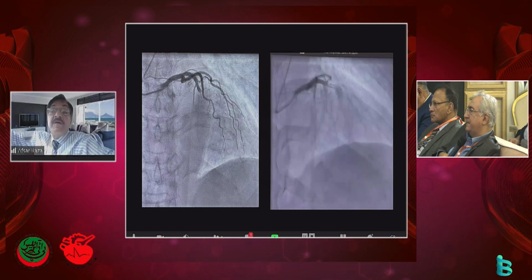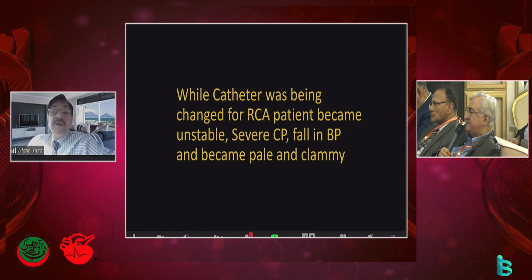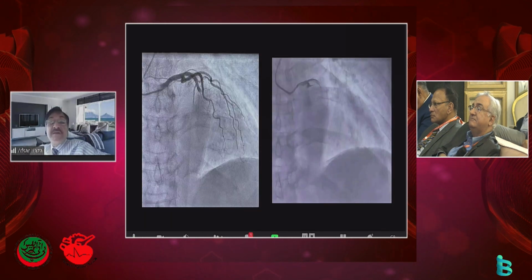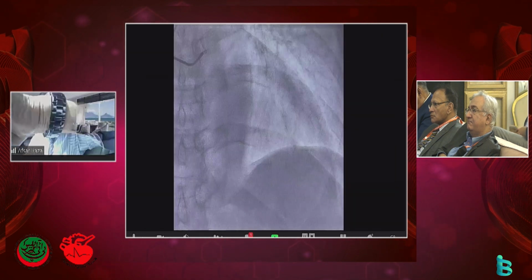The thrombus doesn't just push down like this. It is very unlikely; it has to be air. I think my personal feeling is that it could be a spasm. I will show you the echo as well.